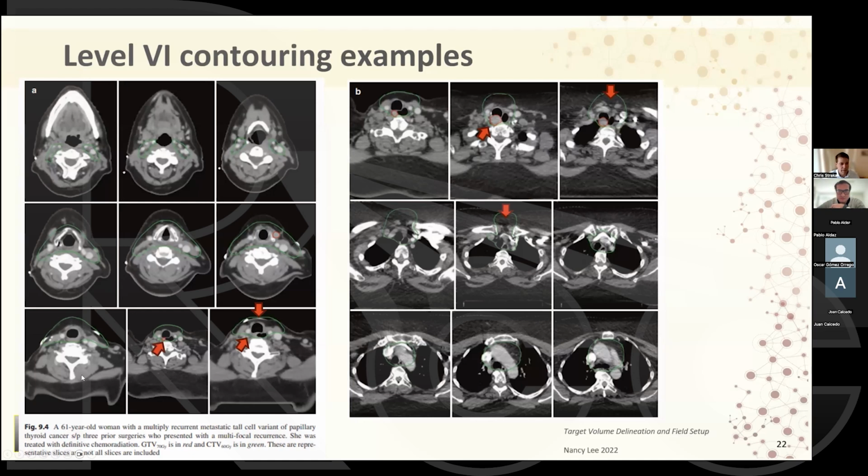I will say that I would disagree a bit with the contour. I don't know all the details of the patient, but I was surprised to see, if we look on this slice right here, very skimpy coverage, basically no margin on gross disease there. So I was a bit surprised to see that, but I do think it's worth it. Since we're always empirically covering regions, sometimes it can be helpful just to see what disease actually looks like in that area.